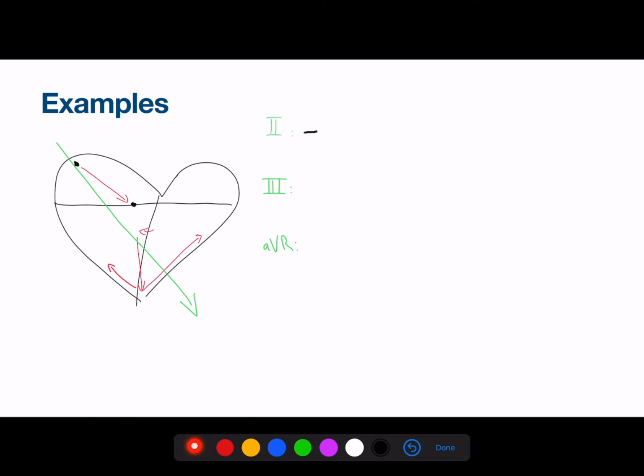Then the depolarization of the atrium, the P wave, is positive because it goes to the positive electrode in lead 2. Then, due to the AV delay, we have again the isoelectric line because there are no action potentials at that moment. Now, the septum depolarizes from left to right, so we have a small negative, which is the Q wave.